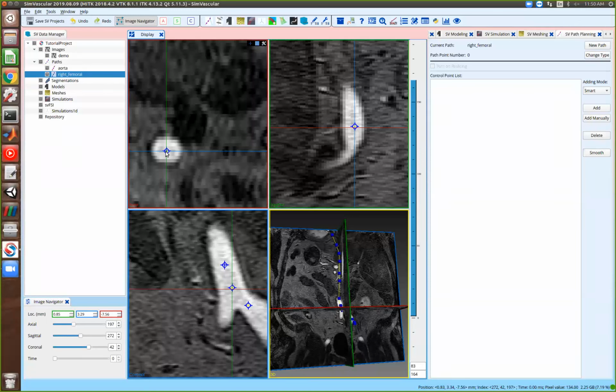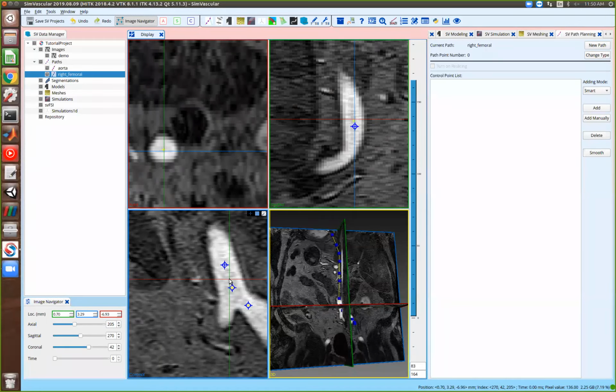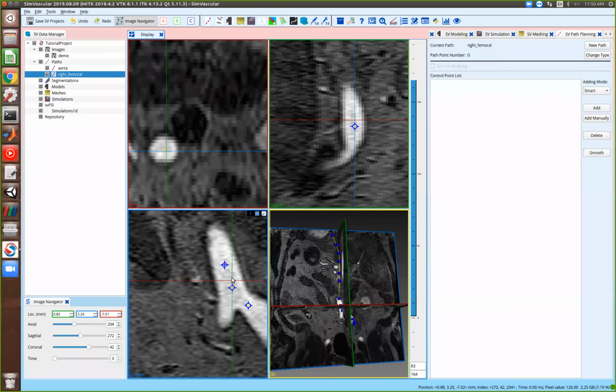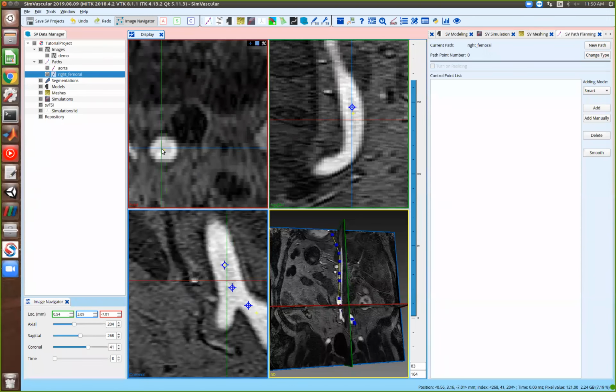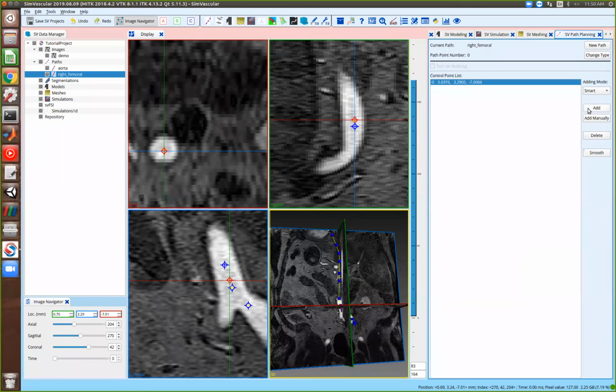and that there is that overlap. So just to show that I don't need to be exact, I'm going to go a little bit above this one and say it splits off from the direction there. And, you know, it's not overlapping exactly, but it is intersecting with that path line. It's in close proximity. So that seems like a pretty good place to start. And I'm just going to click add.